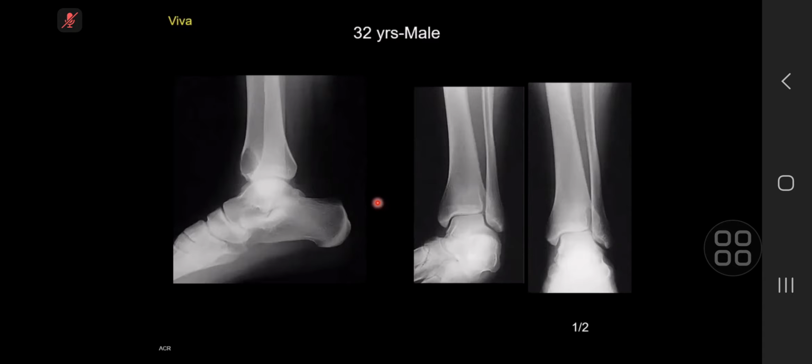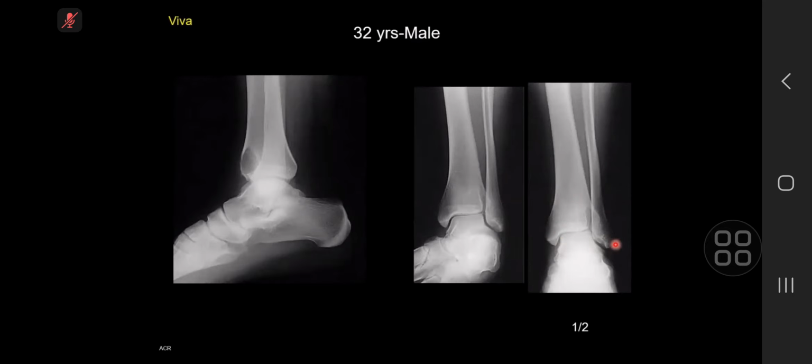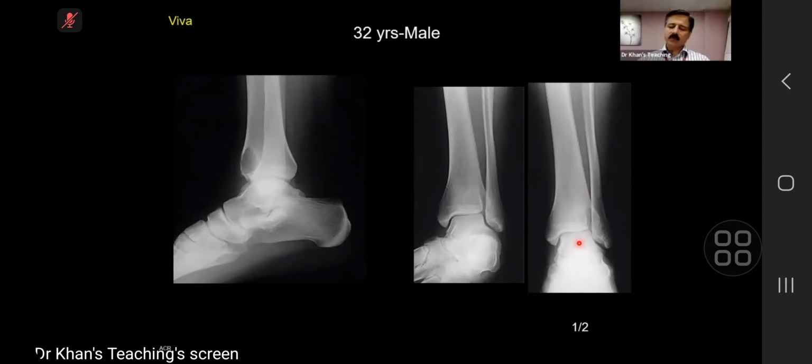It has a narrow zone of transition, a benign lesion in this location, which is not entirely epiphyseal. I would include a hint. Reconsider. Has it gone into the epiphyseal? It is epiphyseal, sorry. Right? Yeah. So it is a subarticular location, so I would consider giant cell tumor as well because the epiphyses are closed. Excellent.